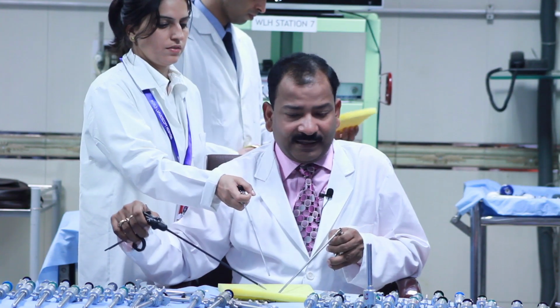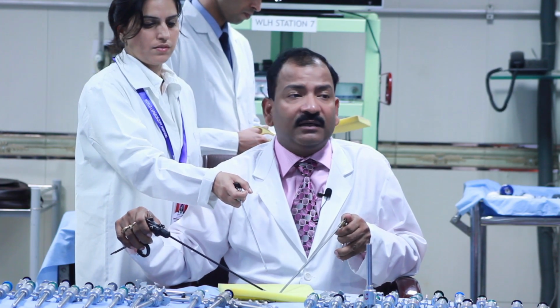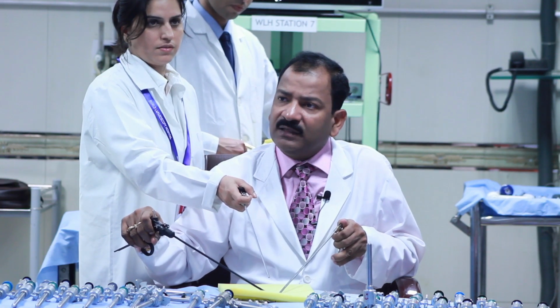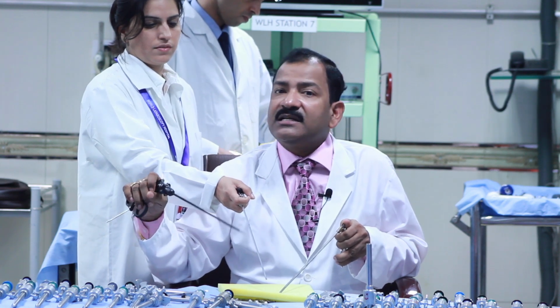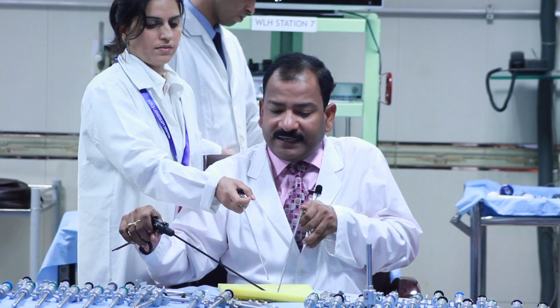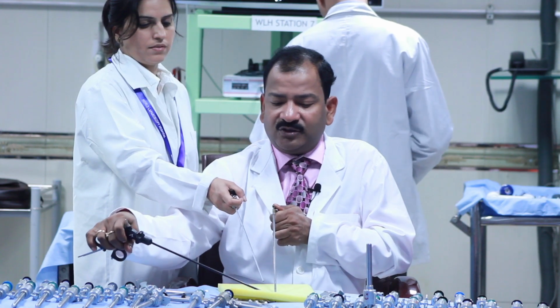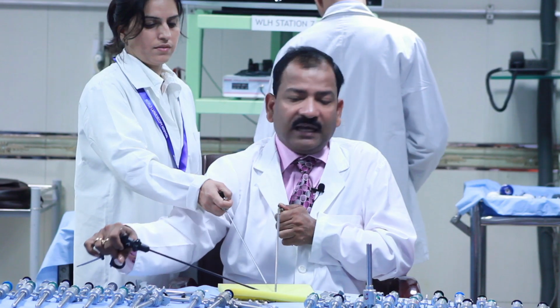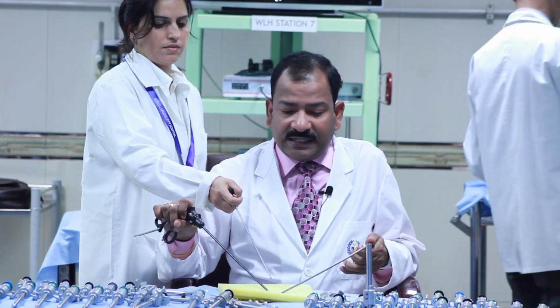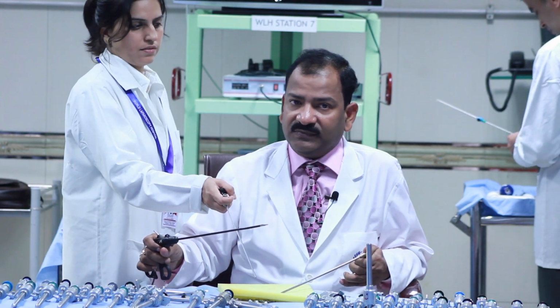This side 30°, this side 30°. Two azimuth angles make one manipulation angle, isn't it? But sometimes, suppose the inferior epigastric vessel is there, or sometimes we do an ipsilateral port position, then one azimuth angle has to decrease. Now, this is 15°. If this is 15°, this has to become 45°. And if this side is 20, then this side will become 40, so that ultimately the manipulation angle should be 60°. You got my point?